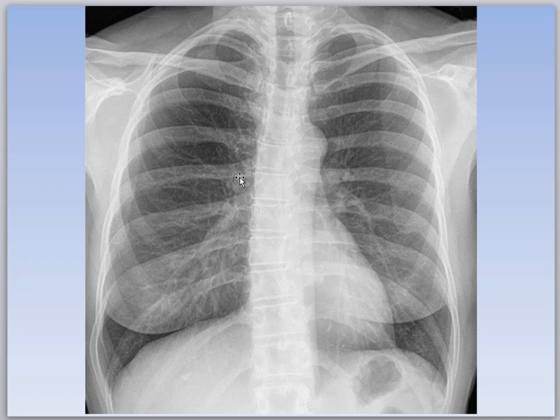So this right here is a pulmonary artery. The other one is right here, a little bit harder to see. And that's the inferior branch of it. That's inside the lung tissue. You can see that it looks like a little artery going down. You can see the costodiaphragmatic recess very nicely right here. That's real easy. Again, a really important structure.